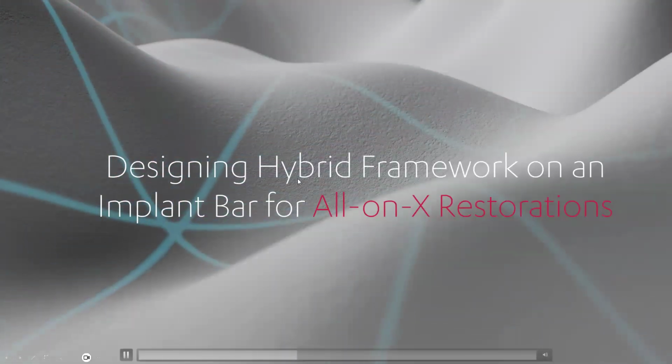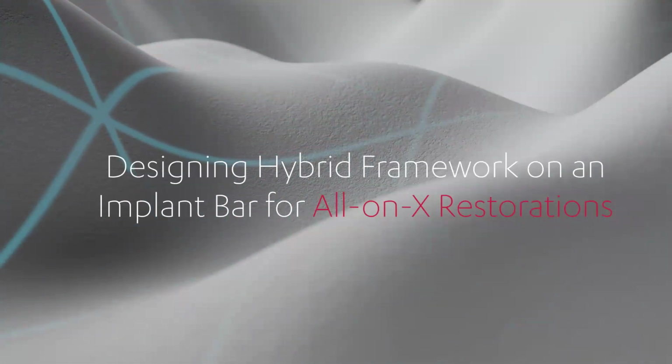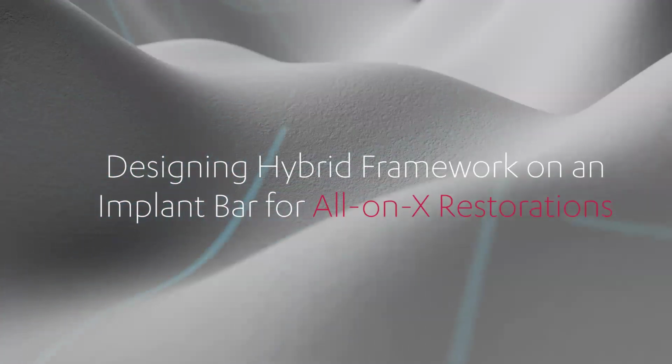Hello, everyone, and welcome to this webinar. Today I will show you a few options on designing a hybrid framework on an implant bar for AllonX restorations. There are quite a few things to know, and there are a few methods to do it with 3Shape software. So I'll try to explain how this can be done and how to obtain good results relatively easily. Also, what to look for during the design to make it as smooth as possible.